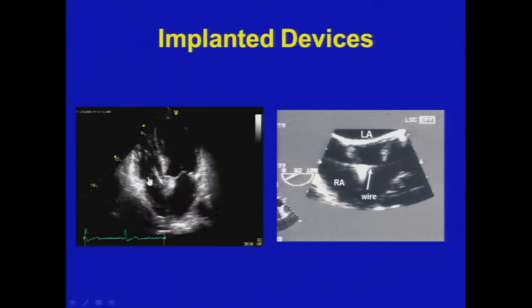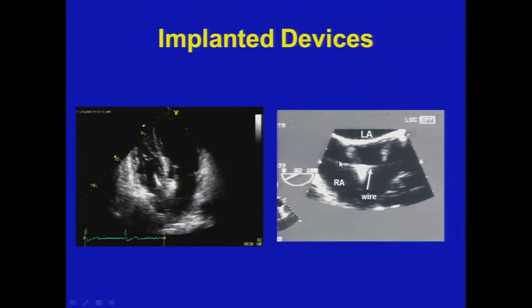But also remember that these pacemaker leads can be involved by pathology. Here's a patient that we saw many years ago who had an infected knee prosthesis with Staph aureus. The knee was drained repeatedly, and she had surgery to clean that out, but she was still persistently bacteremic. And you can see that on this pacing wire, here's some artifact, see two masses which were highly mobile, which were infectious lesions.